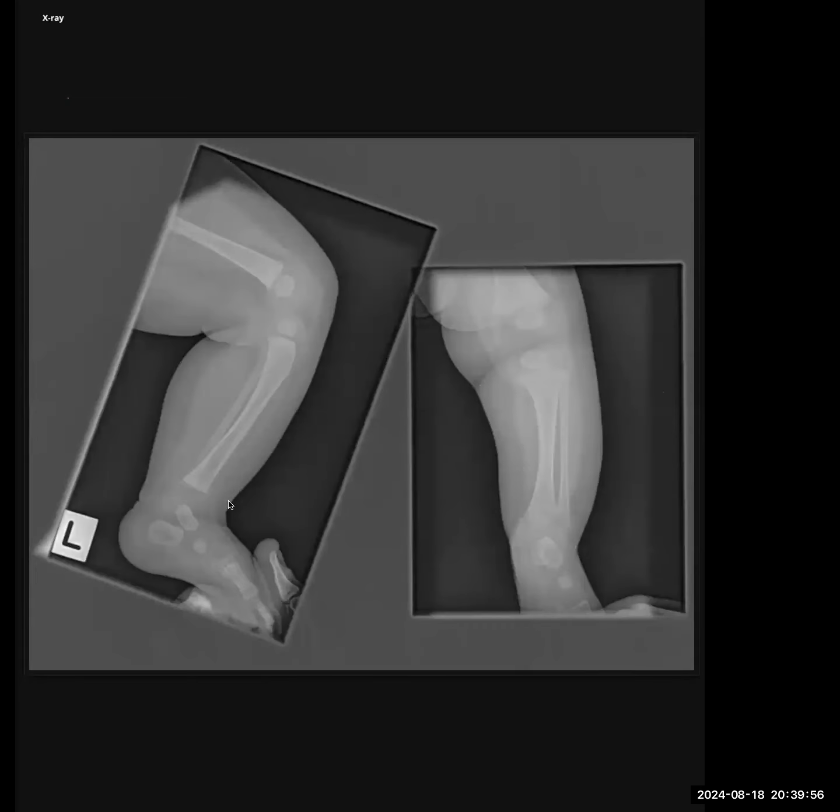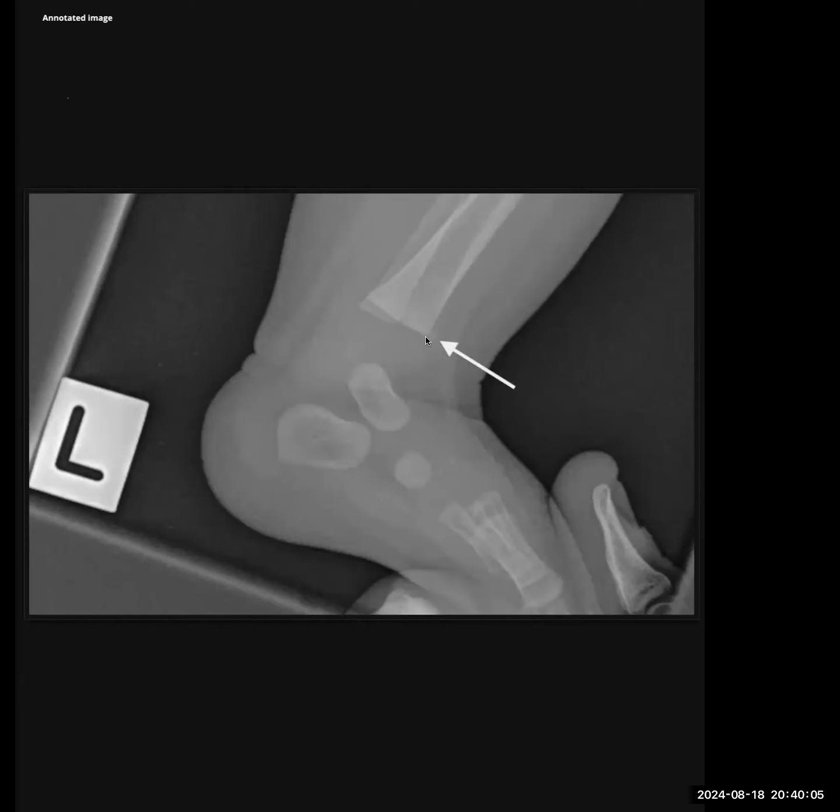I know in real practice you would have zoomed, but when I showed you this area, I actually wanted to focus on this. There is a small corner fracture. Once you had identified that, I'm sure you would have explored the possibility of non-accidental injury and activated the safeguarding team, and the whole thing that we talk about when we consider this. Always order neuroimaging if indicated. If the patient has any brothers or sisters, we bring them in. The whole story that we must go through if we consider non-accidental injury in a patient, right?